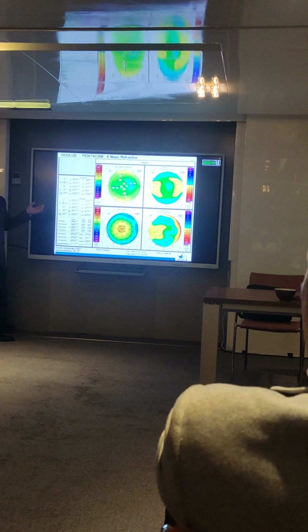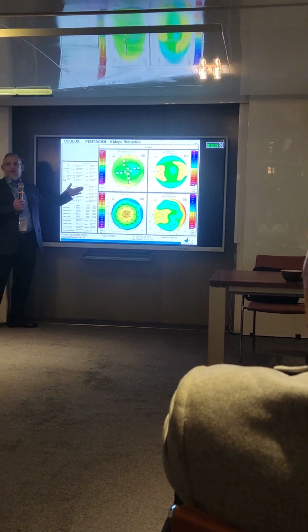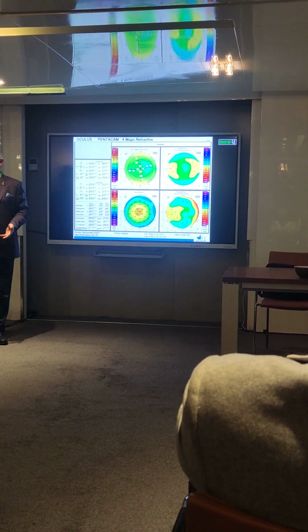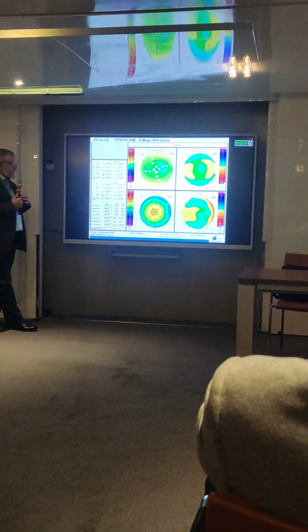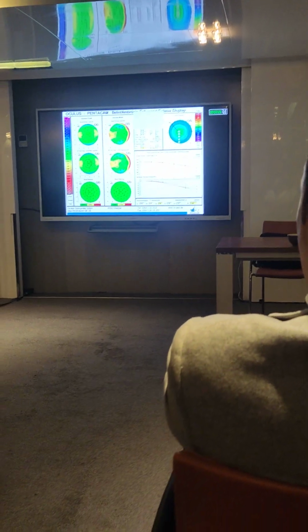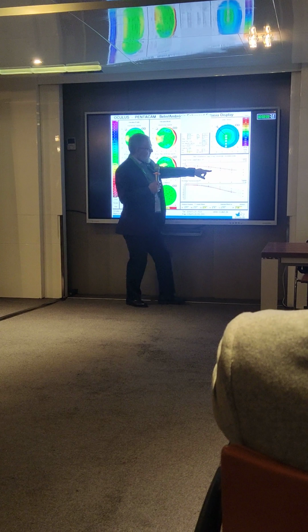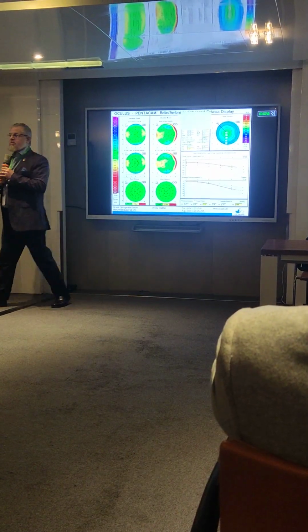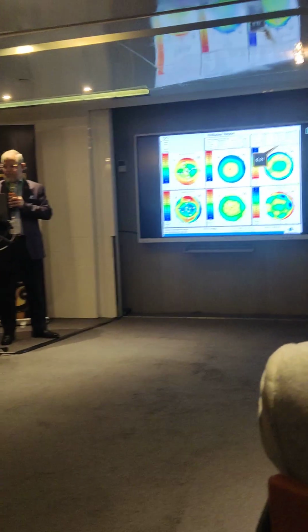Okay, this is a patient who had LASIK actually, and now they have +4, and we want to do refractive lens extraction. The patient is 40, for example. So, as you see, this S-shape movement should notify us that something has been done to the cornea.